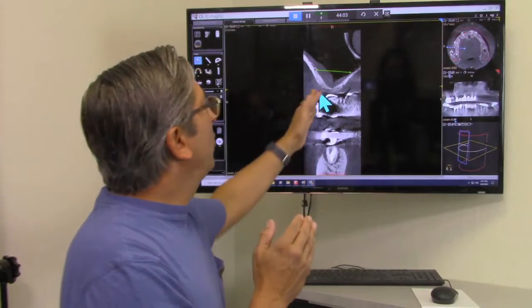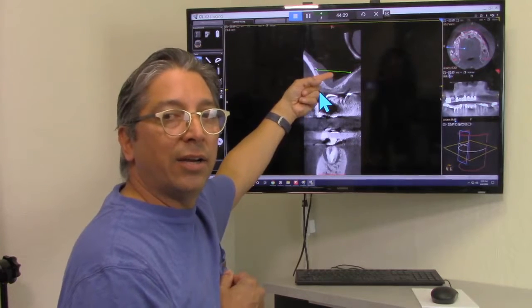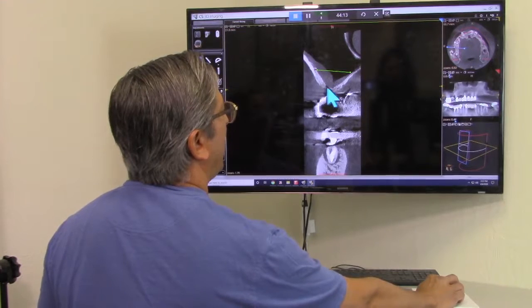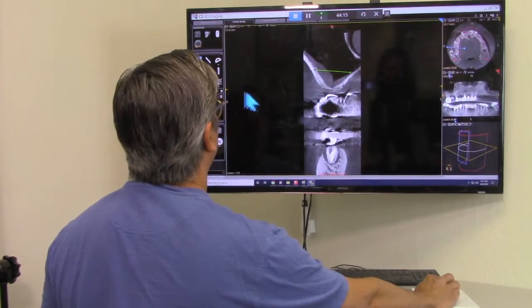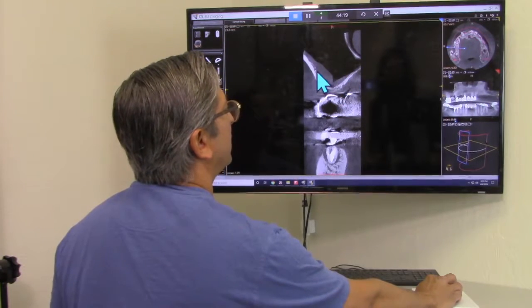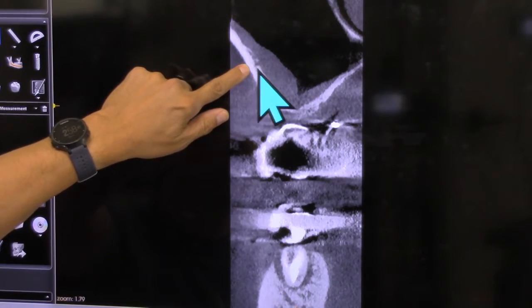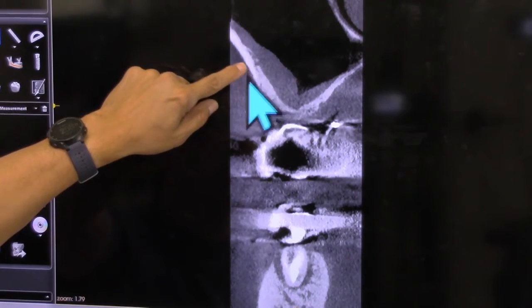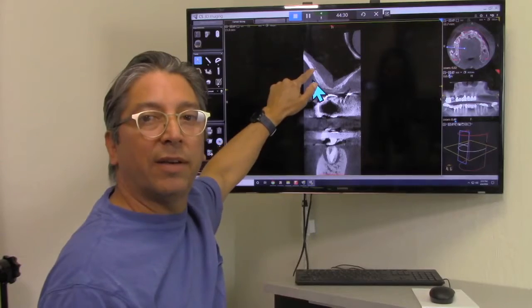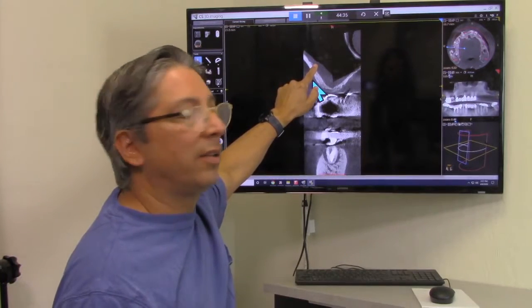So that would be a lateral sinus lift. You would be bringing the bone in from the side here to fill that type of volume. And one thing that you want to make sure that that oral surgeon has the capability is something with the CT, because this person has a vital organ here. So there's some arteries and veins here. So when they cut through that window, you got to make sure you don't cut that, because it's a very difficult bleeding situation to manage clinically if you get into that site.